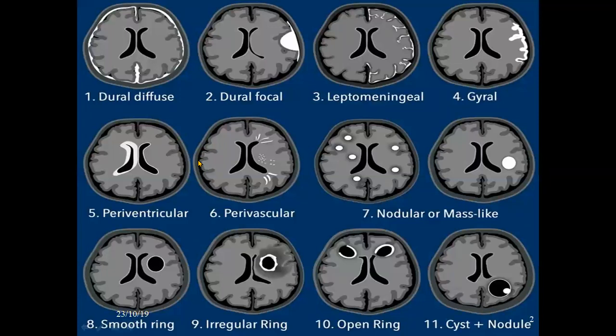So we have here 11 types or patterns of enhancement. Firstly, we have the diffuse dural enhancement.